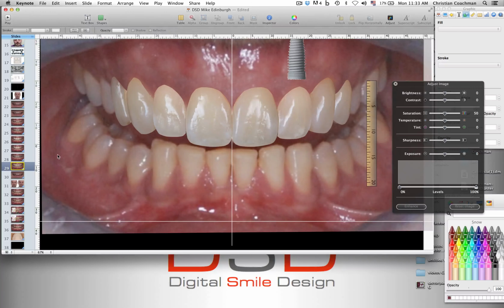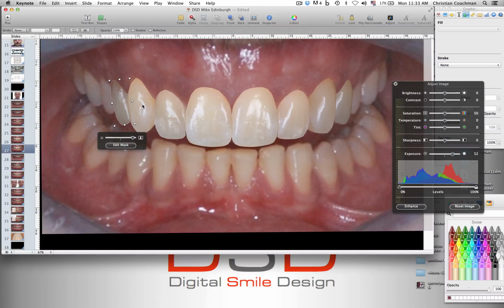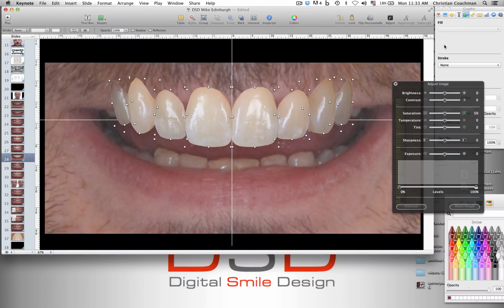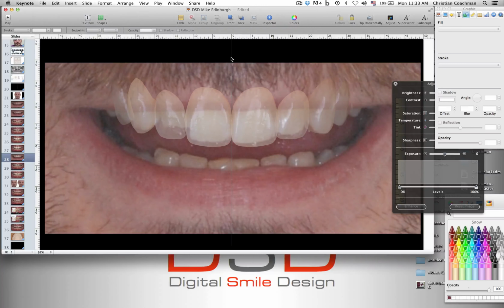You want to bring the teeth from here to here. So we copy all of them, copy, paste over here. Then I will put some translucency to check if I need to move them, like a little bit here, because the retracted photo and the actual photo, they always have some differences. I don't need this line here. Neither this line.